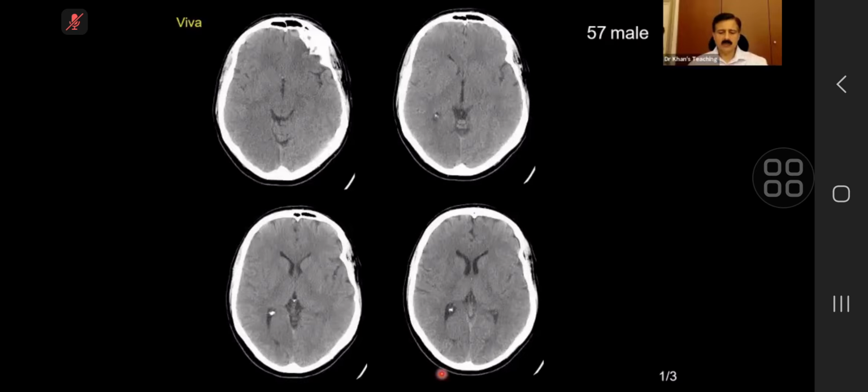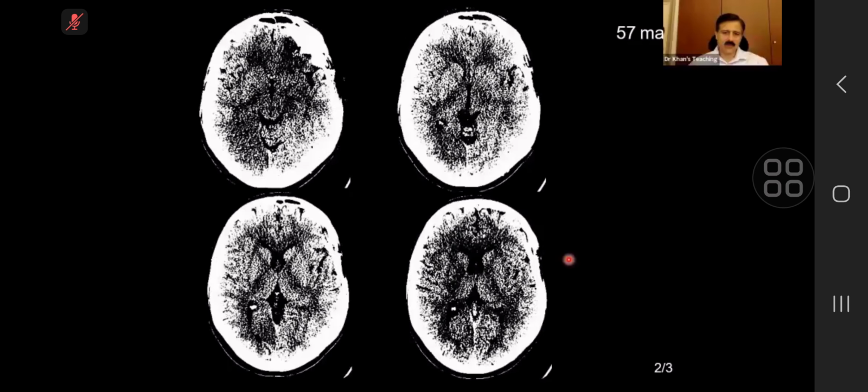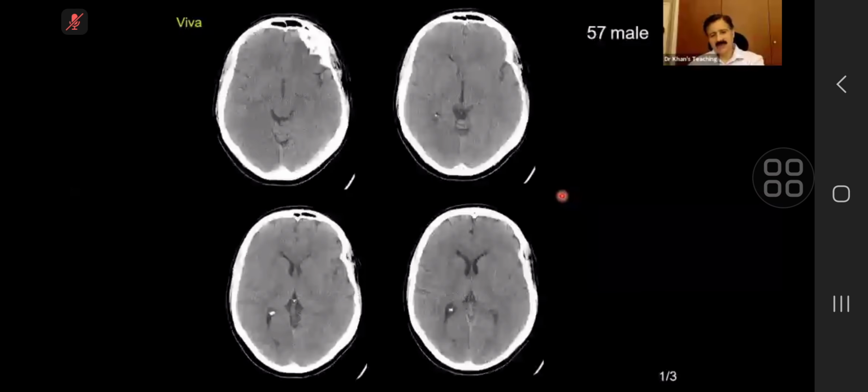Okay. So the right occipital lobe has a normal gray-white differentiation, but looking at the left side on the lower left image there is a... What do you think now? Just concentrate on these two. So the left occipital lobe is abnormal. And why do you say that the left is abnormal? Because... go back.